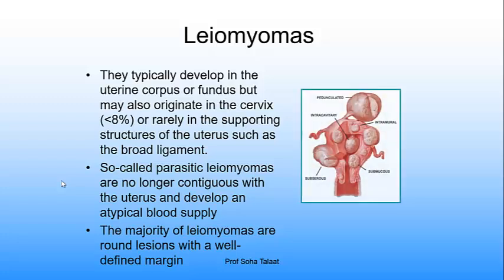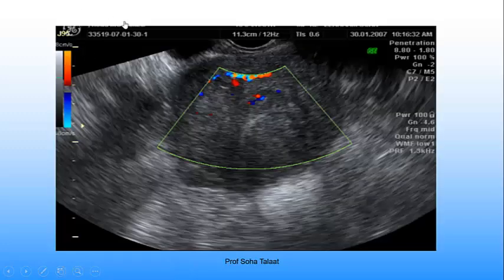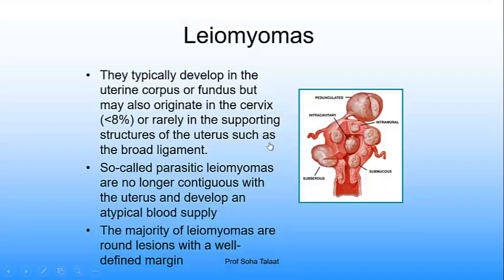But what about the intracavitary leiomyoma? This is what we are talking about today. This is the intracavitary leiomyoma. Here, this one, this is the FIGO stage 0, the intracavitary leiomyoma. And it has a pedicle, and usually, as we say, isoechoic to the myometrium in most cases, except if there are areas of degeneration and there is perifibroid plexus within.